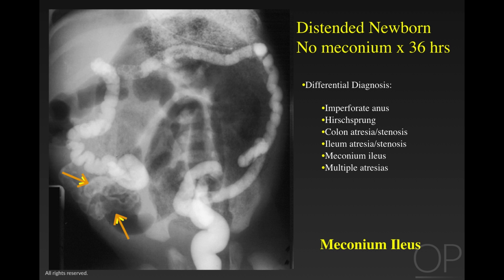So the key teaching point here is that it is very difficult in the newborn to tell the difference between a distended colon and a very distended small bowel.